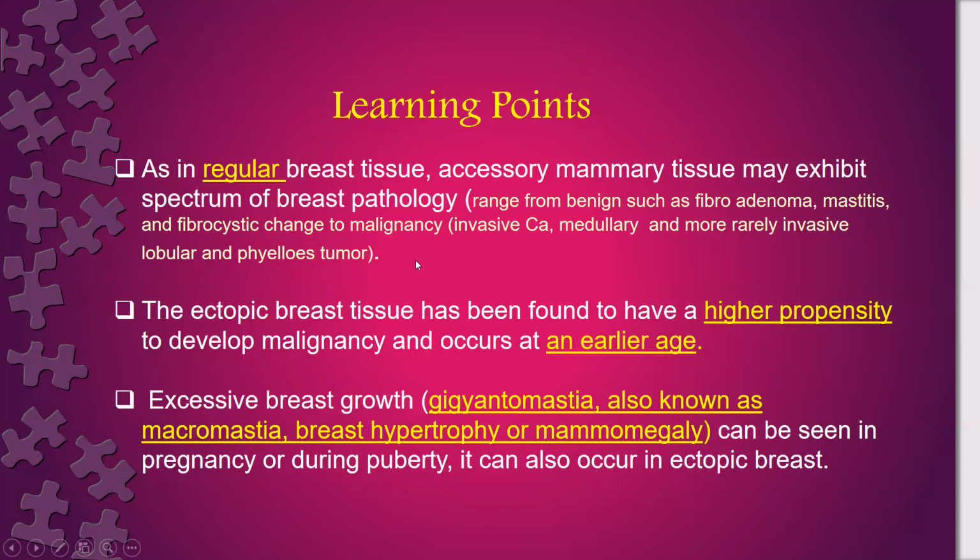She has bilateral galactoceles, a pregnant, lactating lady. She has bilateral galactoceles in her axilla, and 2 malignant lesions, including invasive cancer, medullary, and more rarely might show invasive lobular carcinoma because of the component of the tissue.